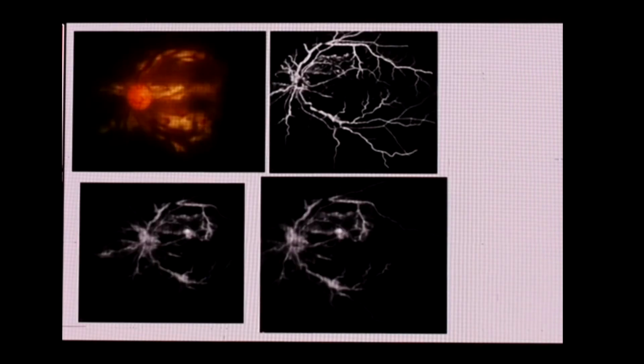But what is interesting is many of our patients with post-fever retinitis land up with a lot of exudation. So this is one such patient, and if you see, there are these lesions over here, probably something like a RAP lesion, but there's so much exudation, and these patients did very well with anti-VEGF and Ozurdex injections. Unfortunately, we could not do OCTA in these patients because of the serous elevation which was there.